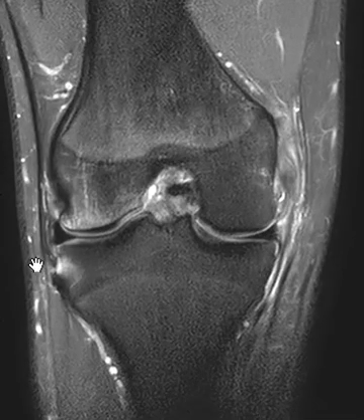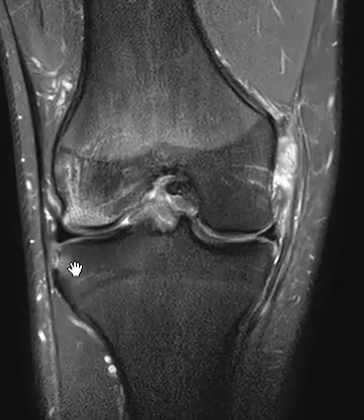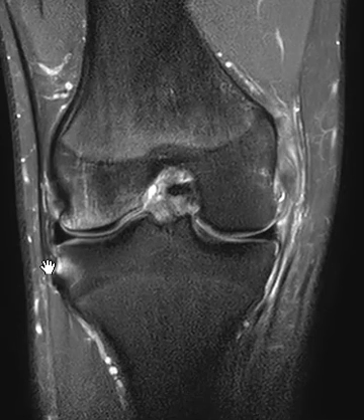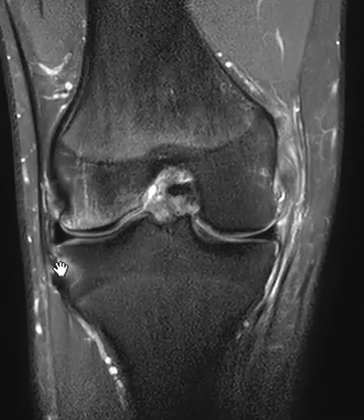This patient also has this interesting little finding here. There's a little bit of marrow edema right here, and this is a little cortical avulsion. Some of the supporting ligaments, the joint capsule attaches over here, and it tore the periosteum. So there's a little cortical or periosteal avulsion fragment, a little teeny bit of fluid there at the attachment. So a little tear here.